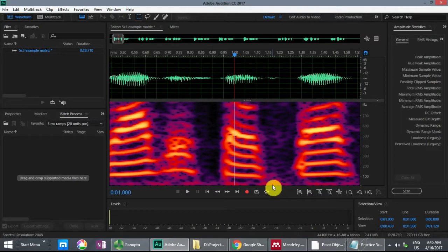So now we're ready to start cutting up these sentences, and if you've read the papers that I mentioned, you'll understand that we are going to chop up these sentences into pairs of words, and we're going to include the co-articulations in a single segment. And then once we have those all chopped up, we're going to be saving them to individual files, which can be later recombined into 100,000 different sentences.